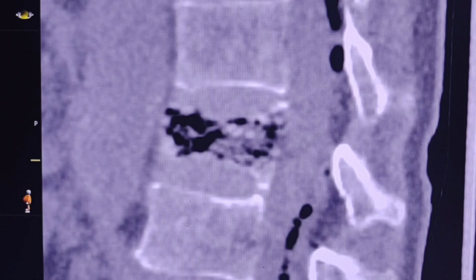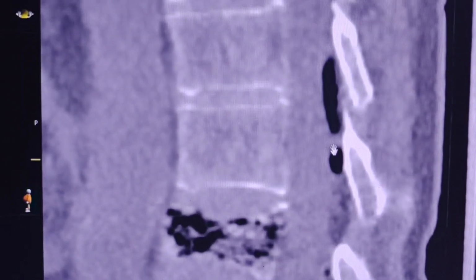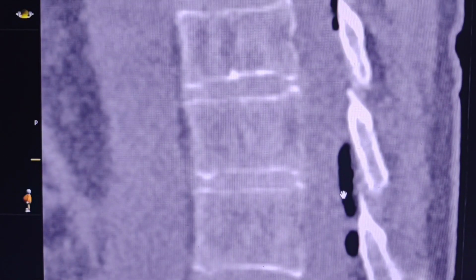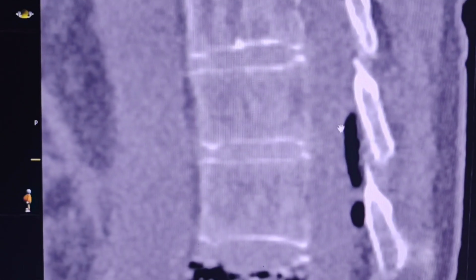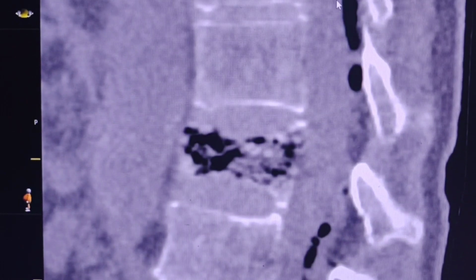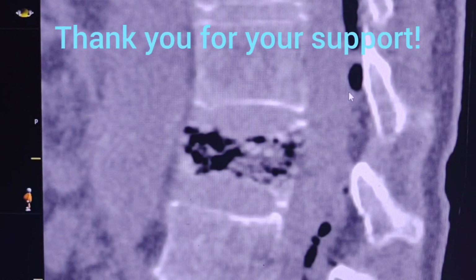In this case there is extension into the spinal canal, and this patient probably will undergo a CT scan or even MRI of the head to see if there is any pneumocephalus. There is a high risk of spread of the disease into the central nervous system in this patient, and this should be mentioned. So further evaluation and investigation should be done.